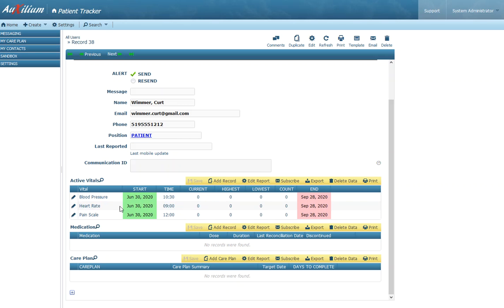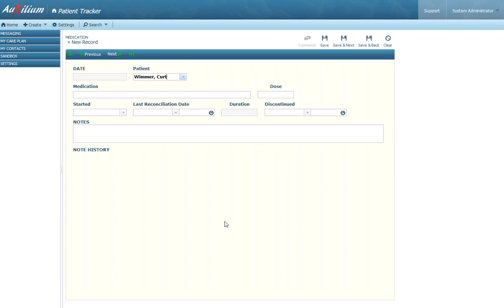In addition to that, we're now going to go in and track some medication. So obviously, or ideally, if we have a medication list for the first reconciliation, we can do that ourselves. So the first thing we want to know is for this particular patient, what medication are they on? Now we know, we'll say, that this patient takes Coversil.